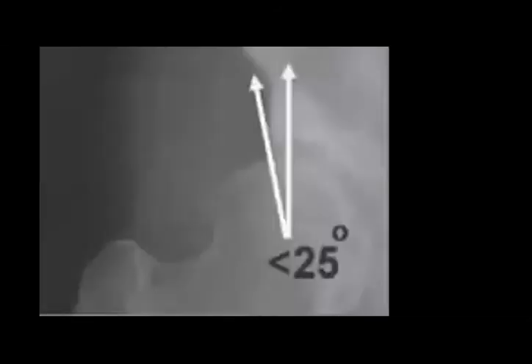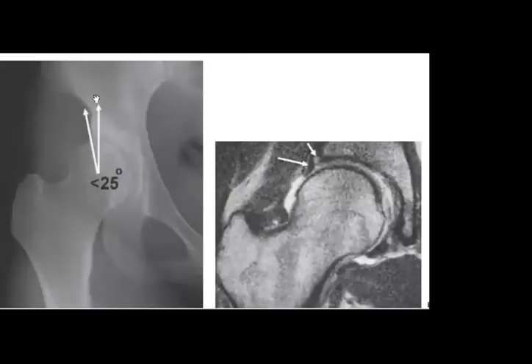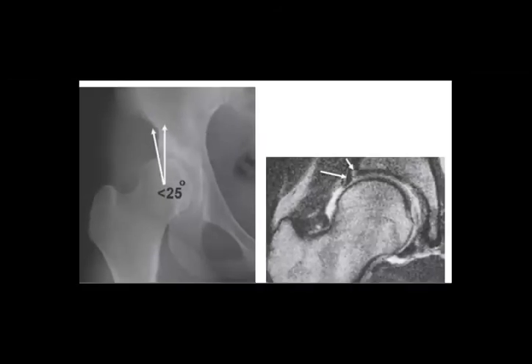So I repeat it, okay? This angle, and you can see clearly the under coverage we talk about. So the femoral head here is partially covered by the acetabulum.